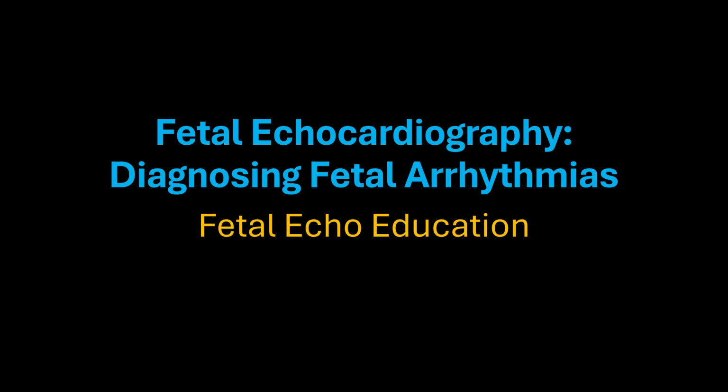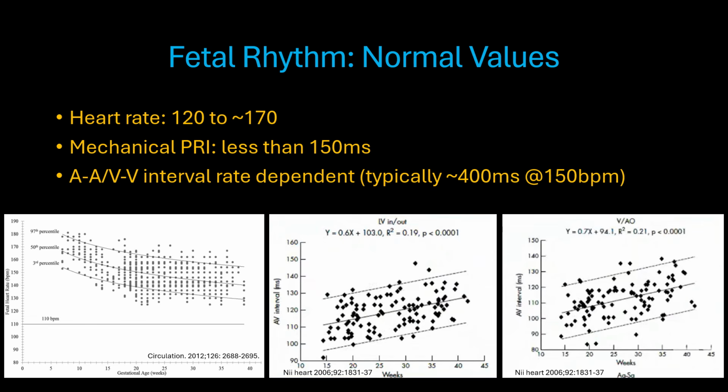During this lecture, I will review fetal cardiac arrhythmias and the echo methods we use to detect and diagnose them effectively. I'll also highlight the proper techniques to provide cleaner, more reliable tracings, which facilitates accurate diagnosis and provides optimal measurements. I just wanted to review some normal values for fetal heart rhythm.